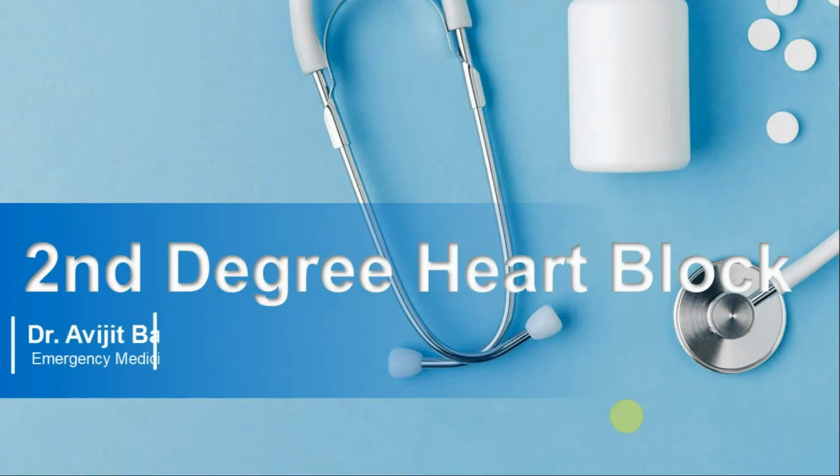In this video tutorial we are going to talk about second degree heart block. Many of you have asked about the differentiation between Mobitz type 1 and Mobitz type 2, and so we are going to show you a lot of ECGs and animations to explain these different types of second degree heart block. I hope you find this useful.